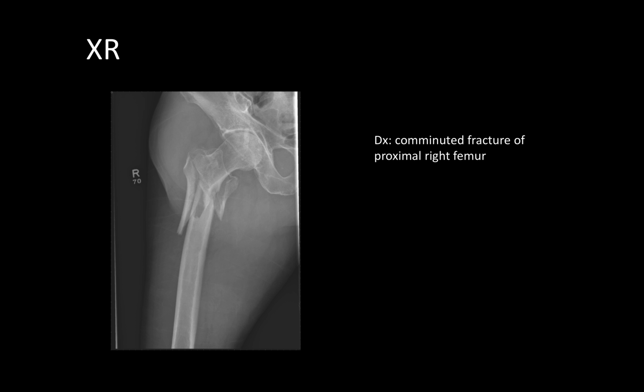In the future, if you're planning on diagnosing and describing these orientations, orthogonal views with ultrasound would have given more information, as well as a transverse view of the same area. In this situation, X-ray had already been ordered and was planned, but in certain populations, if you're trying to avoid X-ray, additional ultrasound imaging could have provided more clinical information.